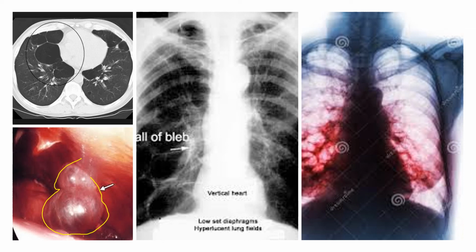And here's a CT image on your upper left. And so you can sort of see the walls here. And so this would be the spinal column down here. The sternum would be up here. And so this would be the patient's right lung and then their left lung. So CT images, they're mirrored, sort of like Facebook Live. It's a mirrored image. So even though we know this is the spine, this is the sternum, and this should be the right lung, that should be the left lung, it's actually switched. Like I said, Facebook Live. So notice that the heart's mostly in that left side there. That makes sense, right? So you can see all these bubbles are actually blebs. These are these aneurysm-like looking things.